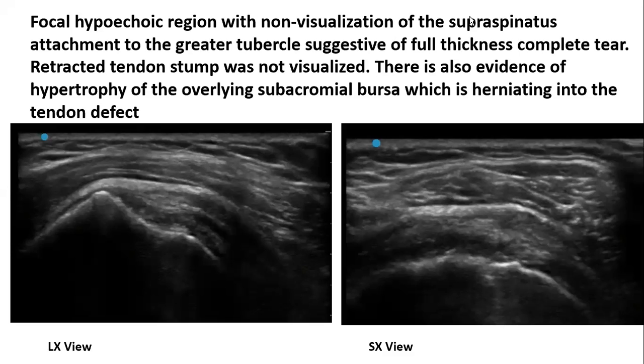If there is any tear, you will not see the tendon attached there. The best thing you can do with real-time ultrasound is to try to do dynamic assessment. That always helps. Sometimes you are not clear, and there will be patients with chronic cuff arthropathy where you're seeing multiple findings, joint abnormality and tendon soft tissue abnormality.